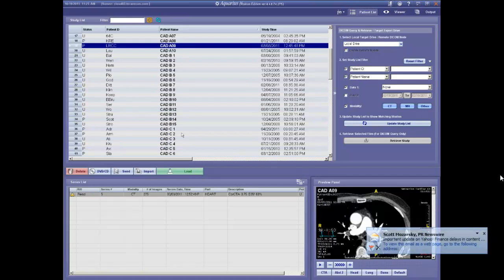Well, that's a good question, and I think that's a question that has taken the experience of maybe 7-8 years of CT angiography and good work done by the researchers. When you can see that much contrast-enhanced blood, and get a view where it is clearly different from the mural calcification that we see in the wall. By the way, we don't see the walls, of course. All we do is see the calcium that's there.